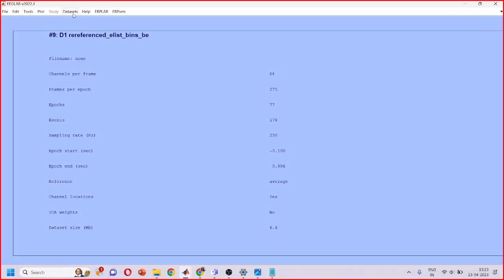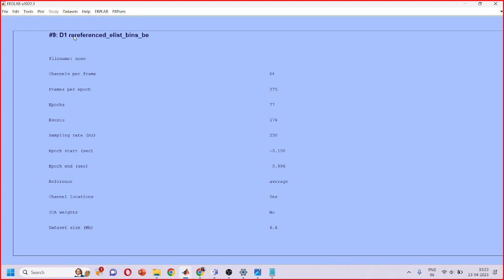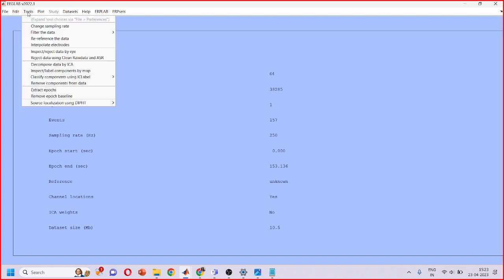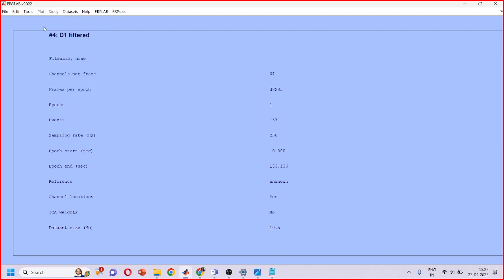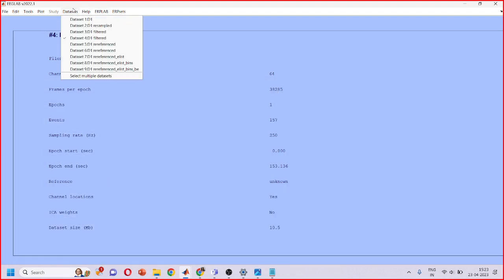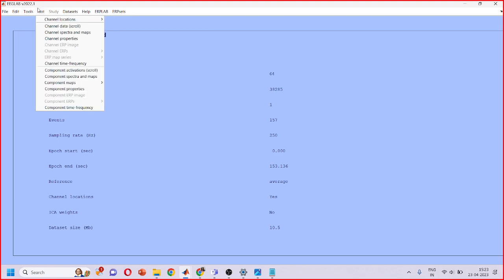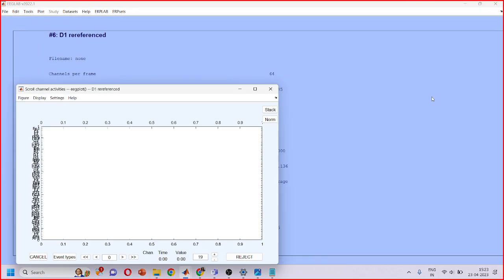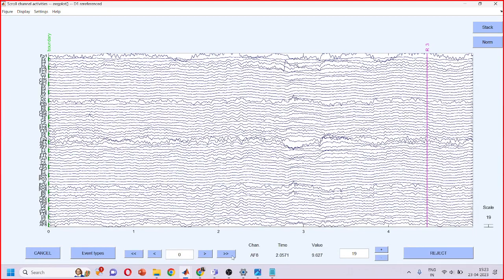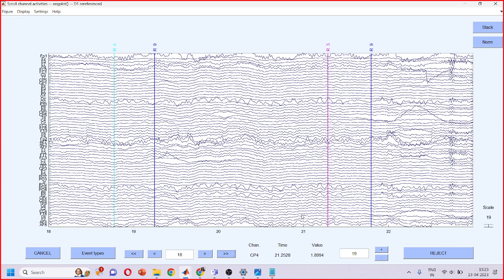we can go back to the data set here. And this is a way to check. Although it's a long way to check whether your data is fine or not, it's always important to keep a check on the quality of the data, and only then plot it. So right, the re-referenced data. That was the latest data that we were working on before we epoched them. And this is one way to look at the data for any anomalies, and we can go ahead and remove them manually.